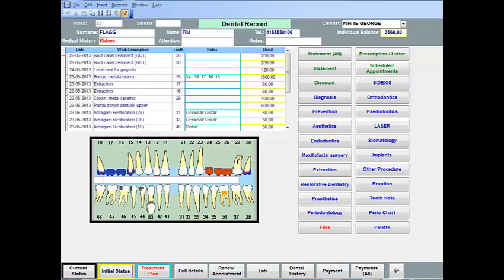During a patient's first visit to a dental office, a dentist will examine the soft tissues of the head and neck, as well as the inside of the mouth. In other words, the dentist will perform an intraoral and extraoral exam. The software enables the dentist to record his findings and follow up on any problems.